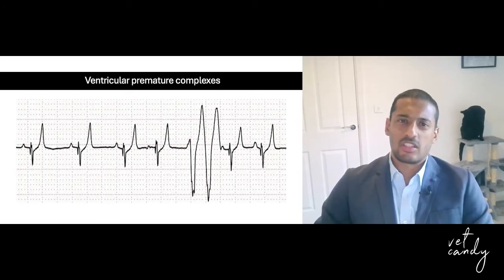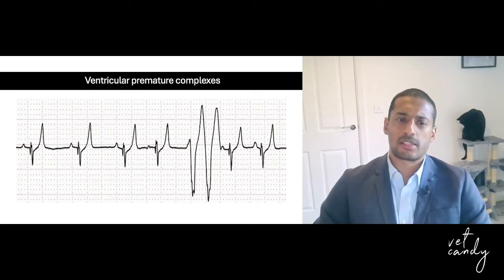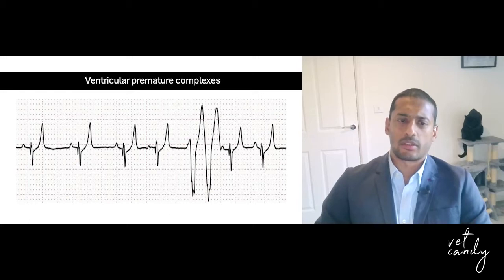Remember, the ECG is a graph of electrical activity over time, so a wide complex indicates a longer duration of activity, slower conduction. This first ECG shows alternating normal sinus beats and VPCs. You can see the sinus beats have a P wave followed by a narrow QRS complex. This next ECG shows 4 normal beats, then 2 VPCs next to each other, termed a couplet.